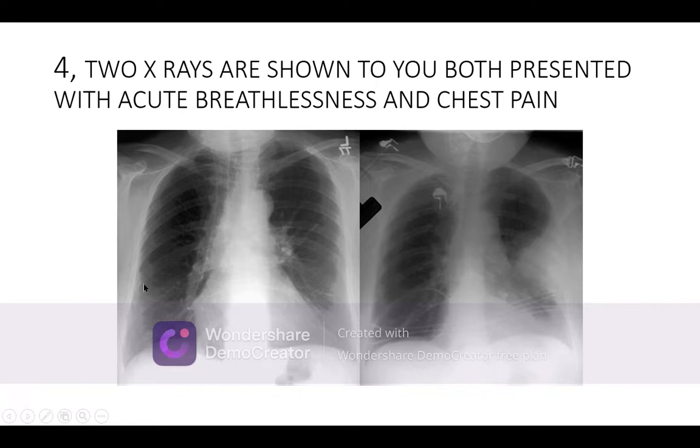Usually seen in this fashion, on the lateral wall or on the base, it is the tenting of the dome of the diaphragm. On the lateral wall, it may project like this. To confirm it, use other views and HRCT, and sputum for AFB, and exclude the other causes which can cause this pleural thickening. And if the cause is found, then the specific measure should be done. For example, in tuberculosis, you have to give ATT for these patients.